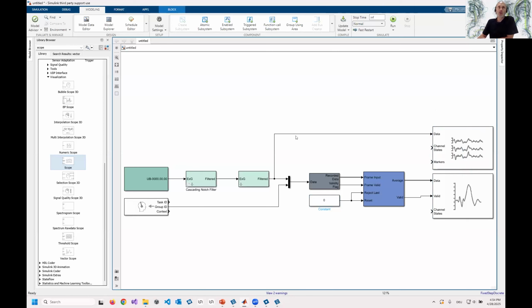While you are acquiring EEG data, it's already filtered. So it's a combination of very high oversampling, very steep anti-aliasing filtering and adaptive filtering. And this makes the output of the headset so clean that you can easily use the data.